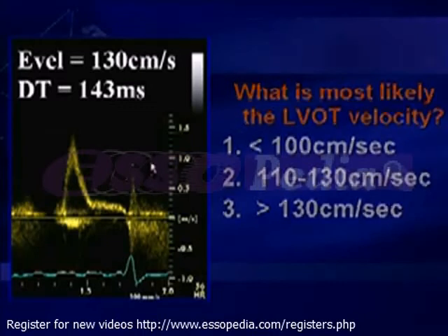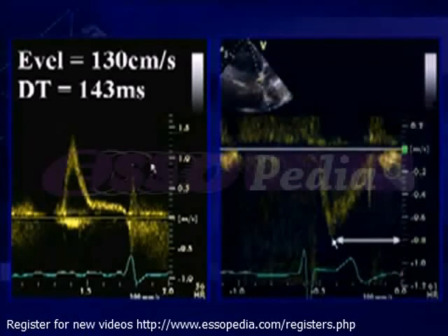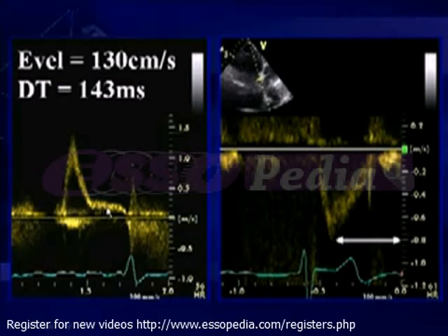And in this individual, we see the LVOT velocity is 0.8, the ratio is much higher than you would expect, suggesting again that this is secondary to an increase in filling pressure.